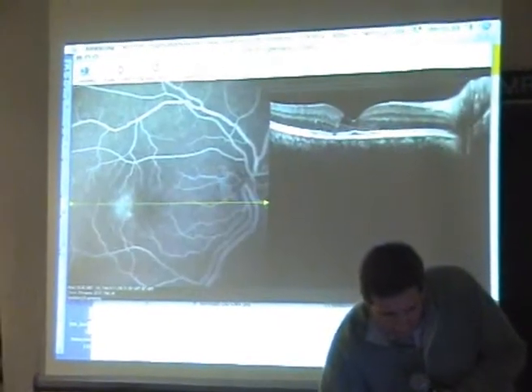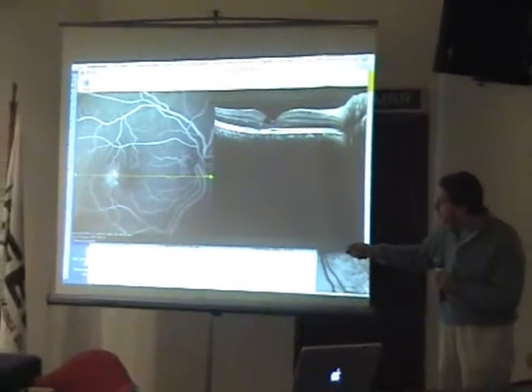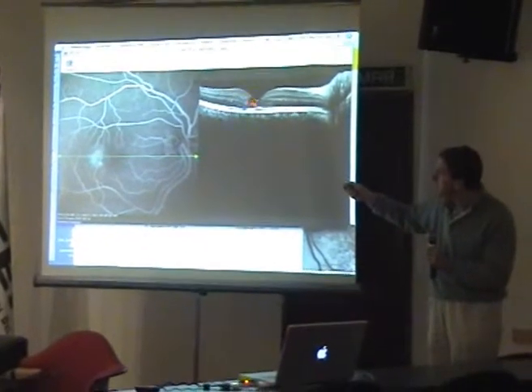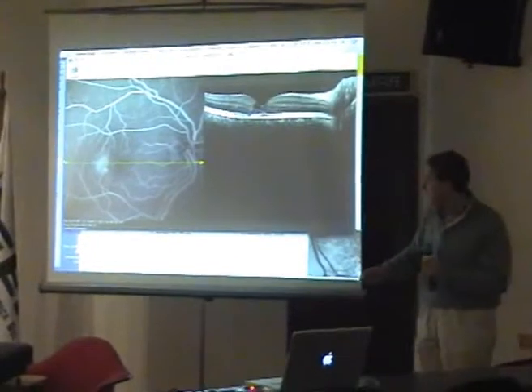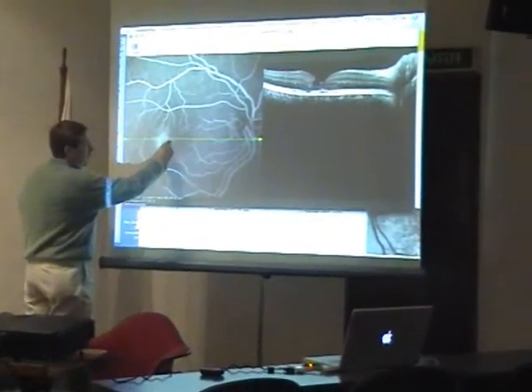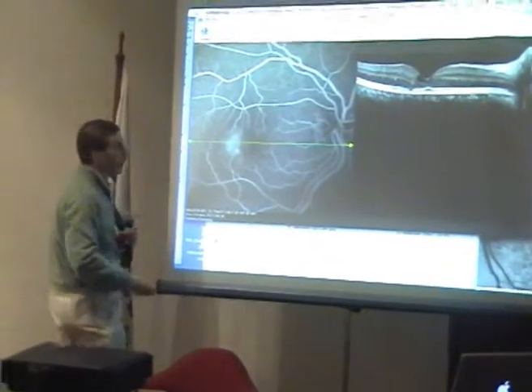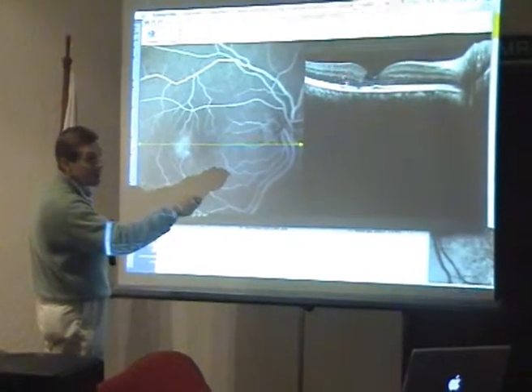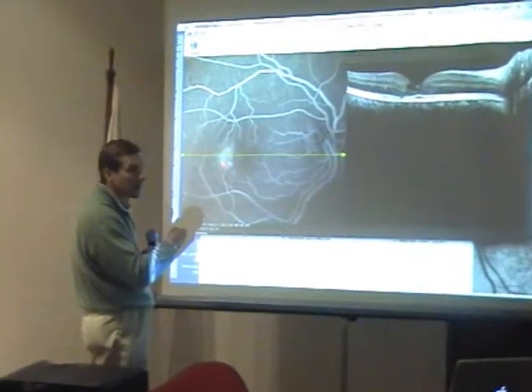And if you go and take point by point, the leakage is here, but is not. And this cyst is completely empty. And actually, you see here, this was the increased autofluorescence, and you see that the leakage is outside. There is no evidence of edema in the neurosensory retina. So we don't know exactly if this is a real leakage or not.